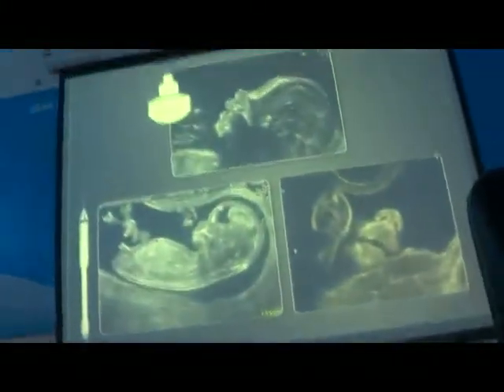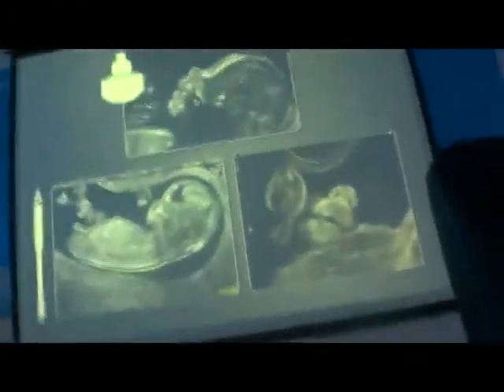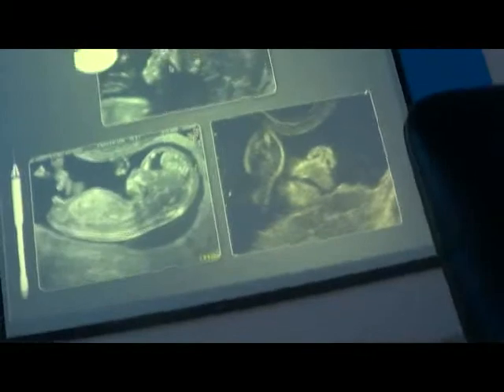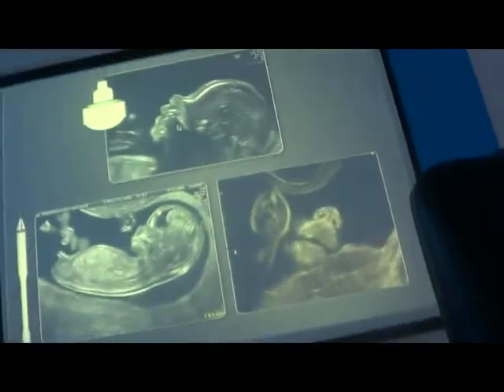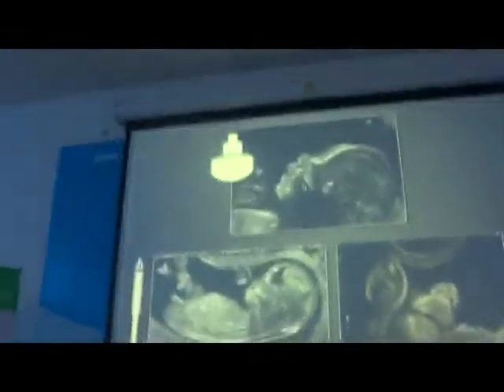Dụng cụ mà chúng ta có dùng để siêu âm thai từ đầu dò bụng cho đến đầu dò âm đạo. We can use 2D probe, and this will be the more than 90% of the case. It will be with abdominal probe. Ở phía trên là cái đầu dò 2D đường bụng mà 90% các trường hợp chúng ta dùng.